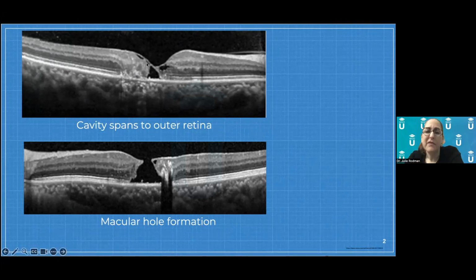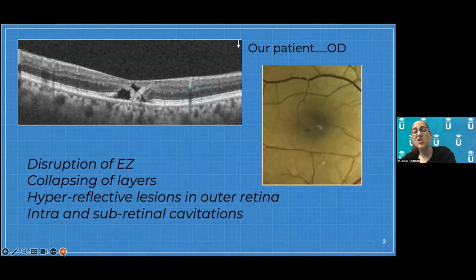And if you do get eventual connection between these cystic spaces, you can actually get a macular hole. This over here is pigment plaquing, hyperreflectivity. And the last stage of it is if you end up getting choroidal neovascularization. If you go back to our patient here, I talked about this funky vessel. That's the abnormal vessel that's going to be affected by the degradation of the Mueller cells. Here you can see the RPE pigment plaquing, and you can see some glistening, really just an indication that there is some abnormality in this area here.